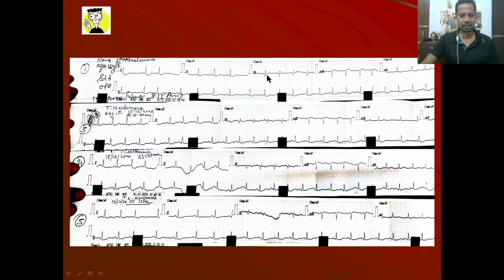Okay, there will be doctors who will say no, this is not MI, and next day they will say, oh, the Q has formed. No, you should not do that. And so this is the MI, and you have to be sharp enough to pick up this change. And then you look in aVF. Okay, aVF, sorry, the aVF got cut, maybe it will come in the next slide. So this was it.